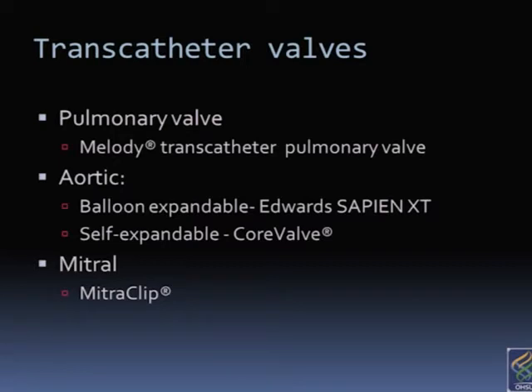The valves that we've been now seeing more rapidly increasing in numbers are the transcatheter valves. They come as a pulmonary valve, which we're probably more familiar with, and balloon expandable and self-expandable aortic valve. I will then touch also on mitral valve repair mechanisms, a so-called mitral clip.